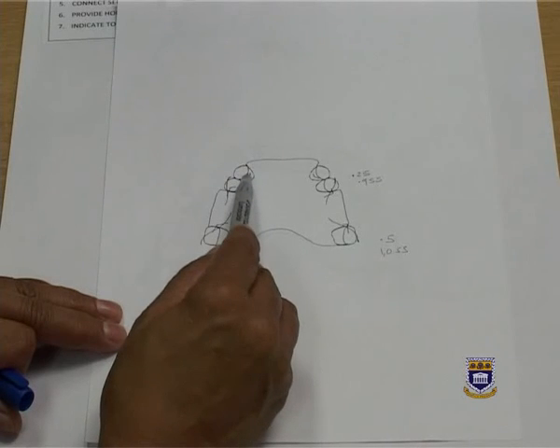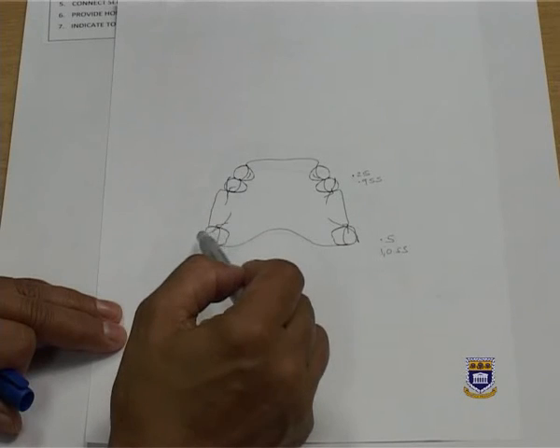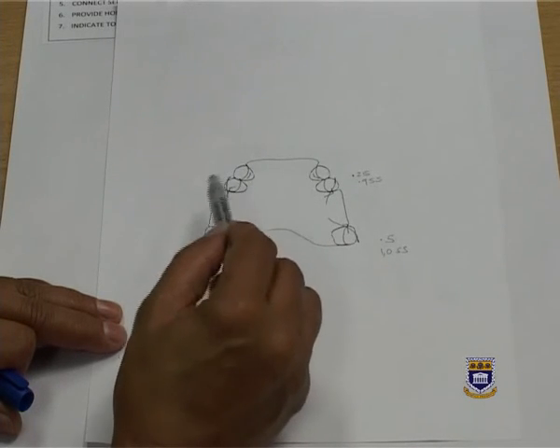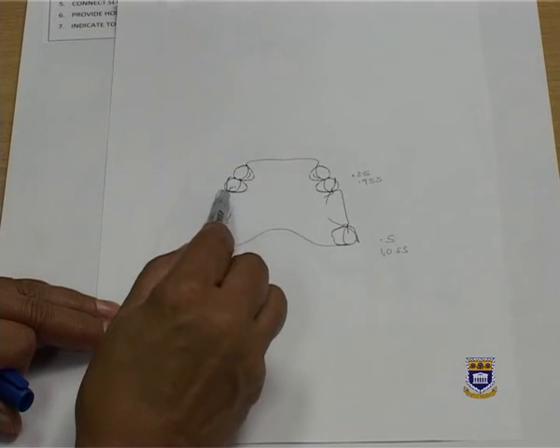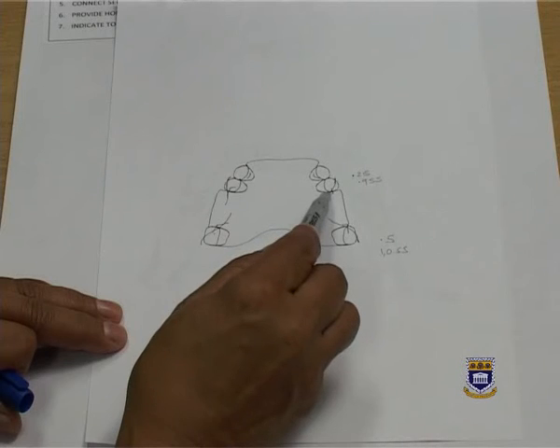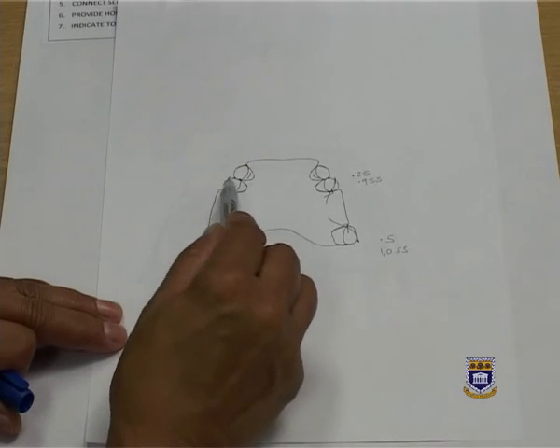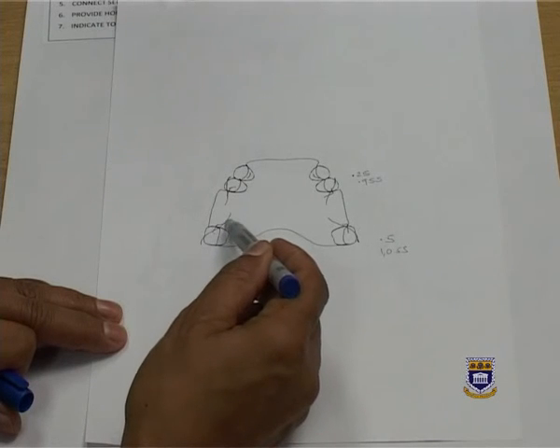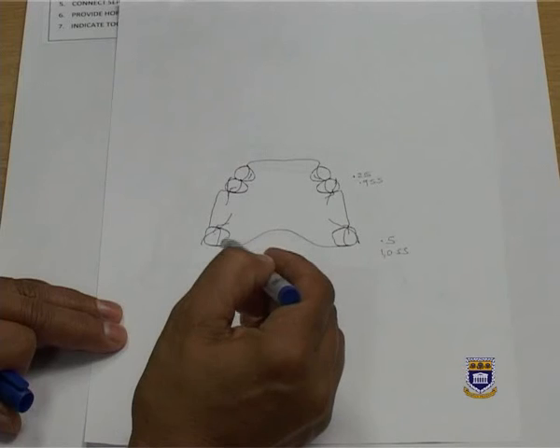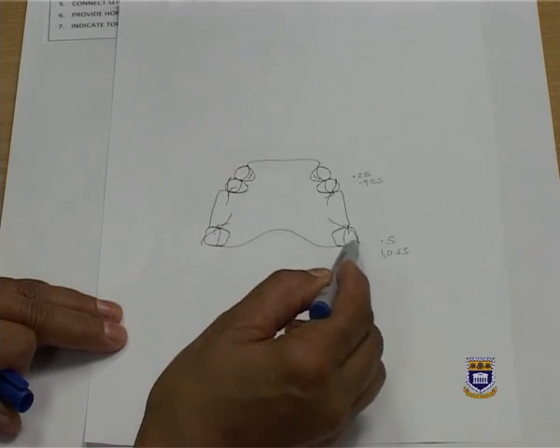I've also got 1, 2, 3, 4, 5, 6 rests. My canine rests are cingulum rests, mid-cingulum rests. I've got a distal occlusal rest on the premolars. These are half round wires that are attached to the acrylic and will be sitting in my rest preparation. I've got 2 mesial occlusal rests on my molars, also half round wire, and I've used C clasps.